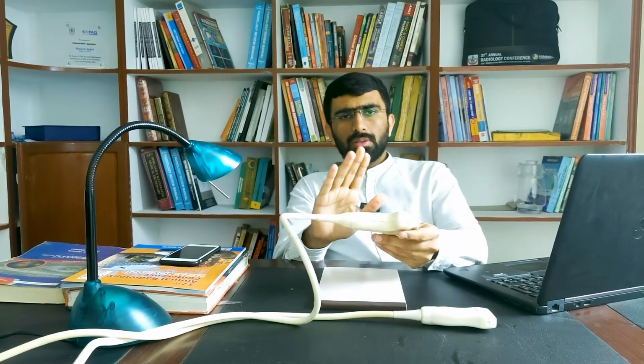So after identifying the pointing end and after placing the probe transversely or longitudinally, you can change the frequency of the probe as well. We already discussed that the piezoelectric substances transmit the ultrasound waves at a certain frequency, and the range of that frequency is written on the ultrasound probe, on the ultrasound machine, or in the ultrasound machine manual. It determines that the frequency of the ultrasound waves being transmitted from this probe can be changed between these two ends.